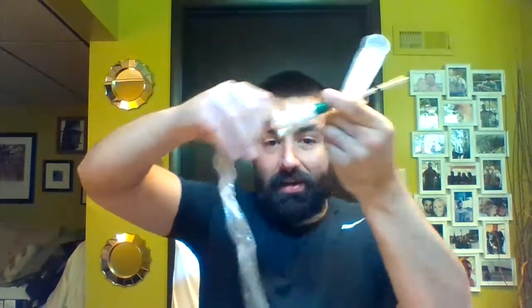When we're going down and suction, I showed you I use my little push-pull. You want to pull that sheath back so it bunches up at the back end there. Okay, and it allows me to get down a little bit quicker versus you'll see people that push it and it all gets bunched up. And sometimes it gets to the point where you're not able to get down there in as quick of a manner. With open suction, same process for the most part, just a different piece of equipment.